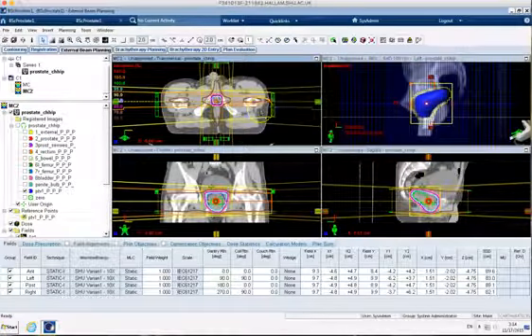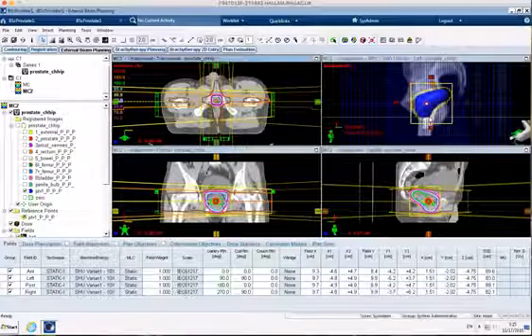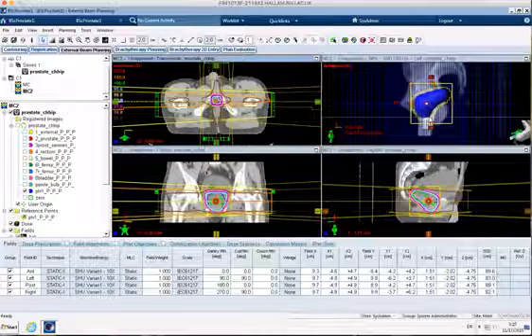So we can see that I'm on that plane there and I'm right at the inferior end. And this is, as I've probably mentioned to you before, probably one of the trickiest things to do, to sort out in our head where we are in the patient, is trying to think in 3D.